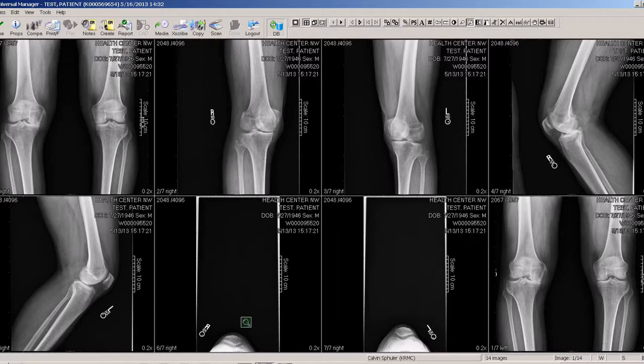If you look down here in the corner, here is the start of our left series. So 1 of 7, and then this being your left. You really want to pay attention to which series you're on, especially when you're deleting images. At any time, if you delete the wrong one, go ahead and click Done, and don't save your changes and start over.